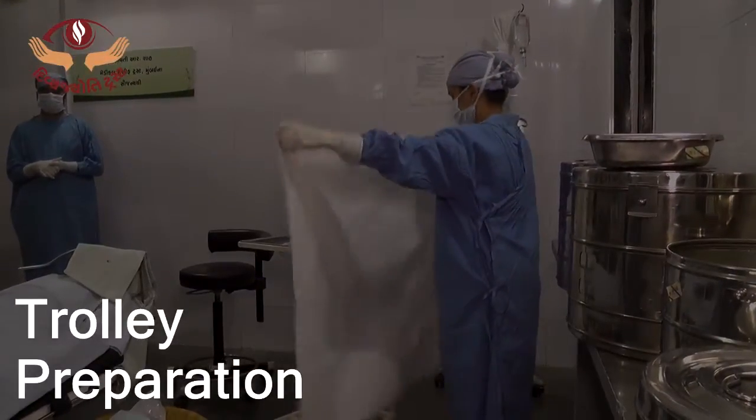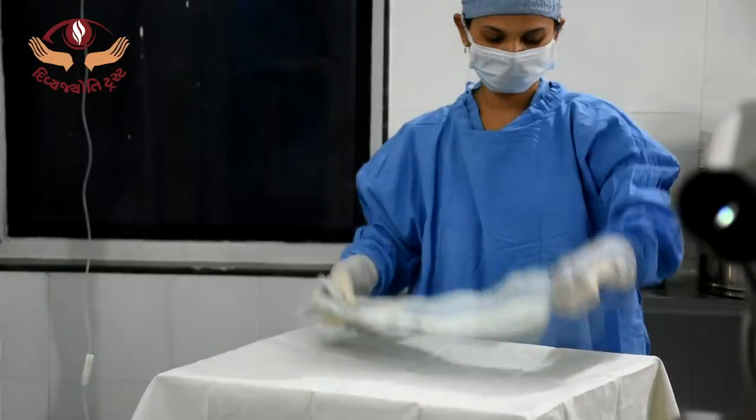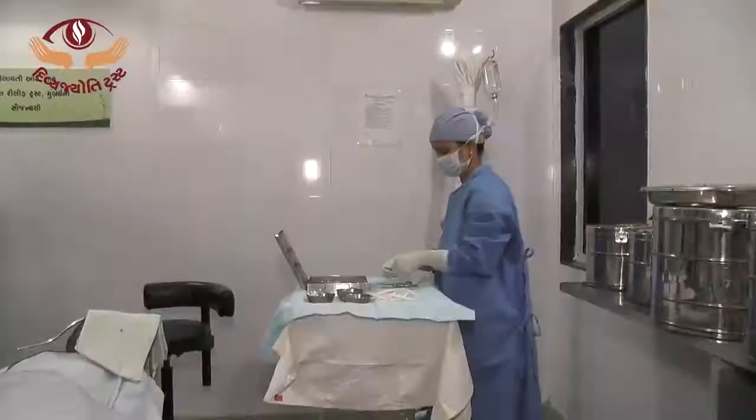Trolley preparation. The trolley is cleaned with spirit using unidirectional strokes. Place a sterile towel first and then a sterile polythene plastic sheet over it. A separate folded towel to be used for sharp instruments.